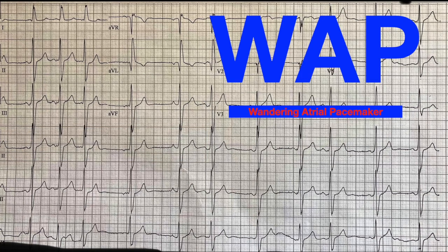Well, normally your conduction comes from the top, right part of the heart down across the atria to the AV node, and then goes down the septum and out to the ventricles and kind of back up and around. And that's how you get your normal morphology. The beat itself comes from the sinus node, generally speaking, down across the atria.